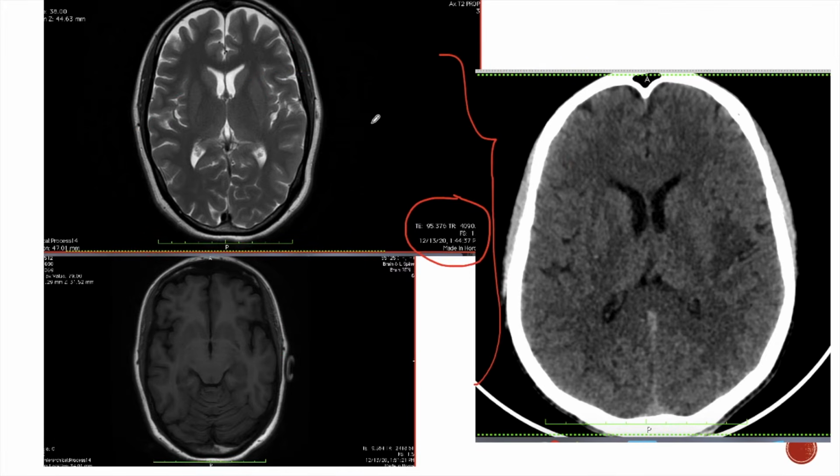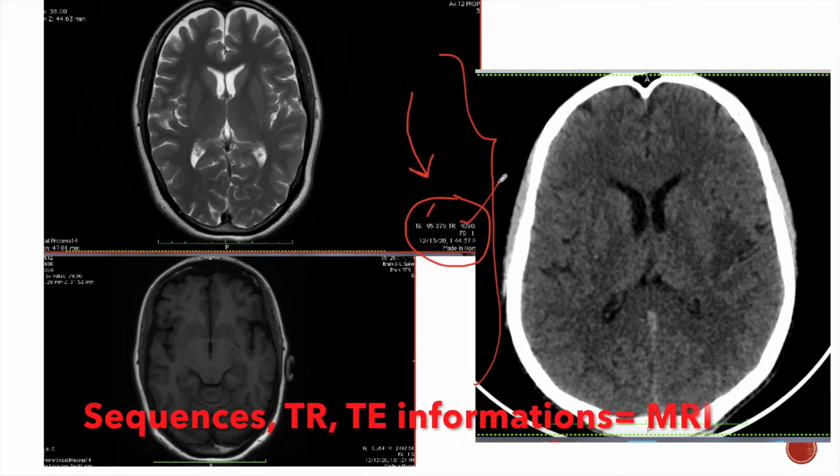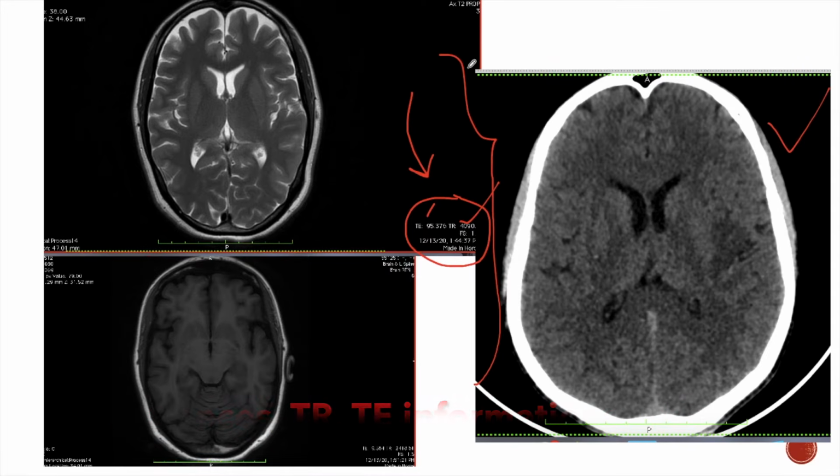Furthermore, if you look at the MRI scan, you can see that in the right hand corner you will have the sequences of the MRI given. The TR, TE will be given in the MRI scan, but in the CT scan this information will not be provided. This also helps us to differentiate CT scan from the MRI scan.